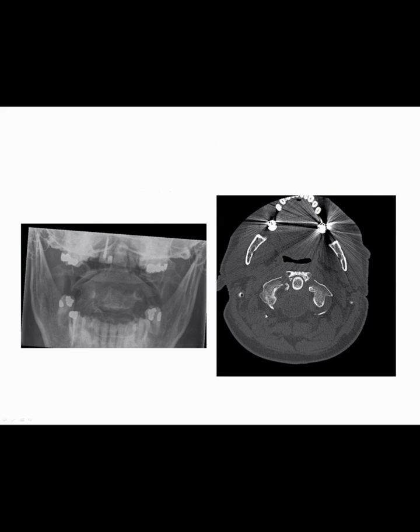These were some images that were provided to you. This is an example of an open mouth odontoid view on plain radiography. We can see the mouth is open, and we're attempting to image the entirety of the odontoid process, although it is partially covered by the patient's teeth. And this is an example of an axial CT slice of the cervical spine, and as we can see, the bone window is on, which allows us to focus on the osseous structures here.